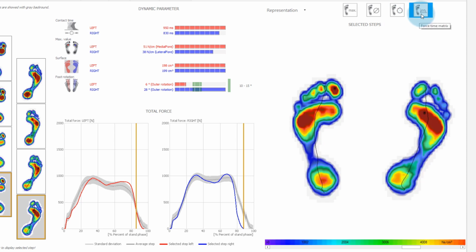The force time integral is probably the most neutral accounting between absorbed pressure and the time of its generation. Mathematically, the rolling motion can be divided into a force curve for each sensor hit. This force curve extends from the beginning of a sensor load to the end and thus encloses an area below it, the so-called integral. If the integral of one sensor is larger than that of another, it is registered as more intensively loaded. In this way, it is color-matched. For many users, this form of visualization is the most intuitive due to the aforementioned neutral force time calculation.